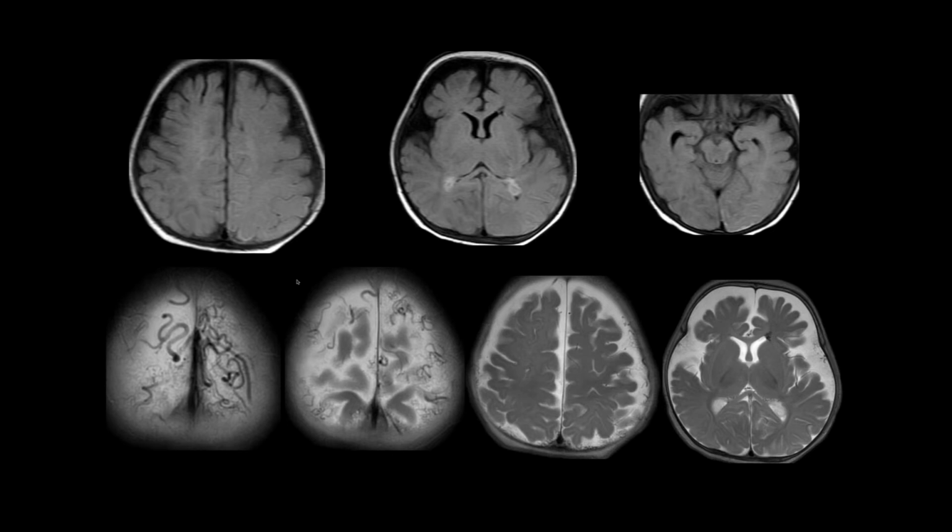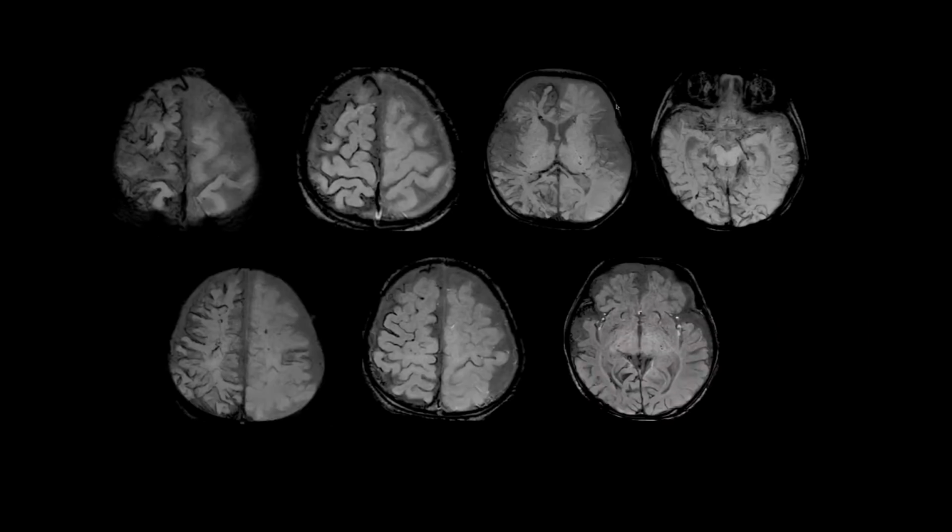In fact, in one of your pictures, you have the left frontal DVA, the developmental venous anomaly, which goes with the entire spectrum of these problems that happens. Okay.